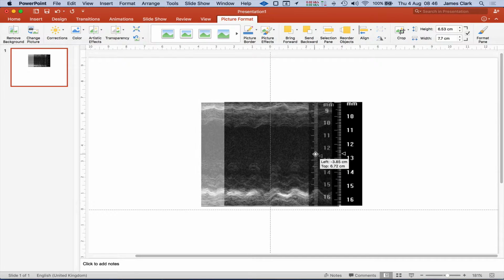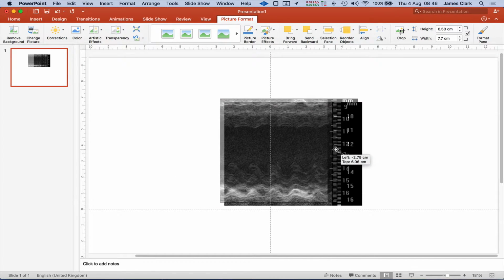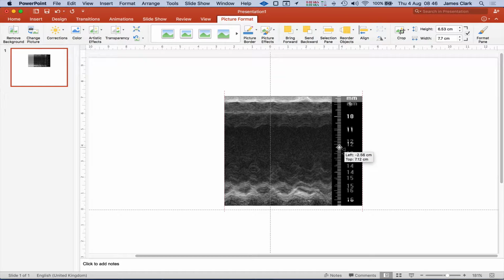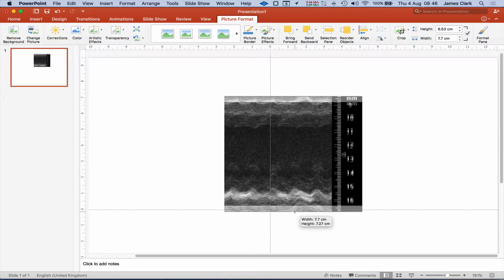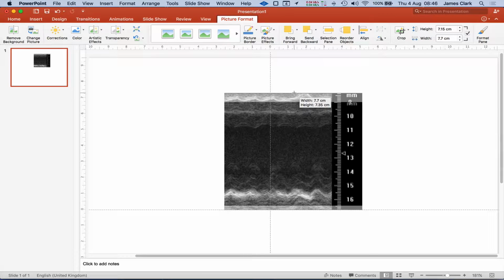So now you can overlay them, and I can line up, for instance, the scales. That's lining up 10, and I can then stretch this image. Again, pressing the command on a Mac or control on a PC allows you unlimited stretching, and all I'm going to do is just fiddle with this until it looks spot on. That's almost there. I'm stretching from the top and the bottom, which there we go, which allows you to then line it up in the middle.